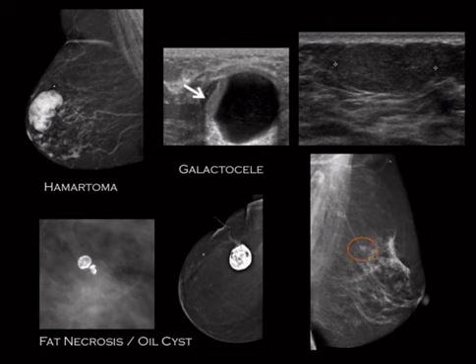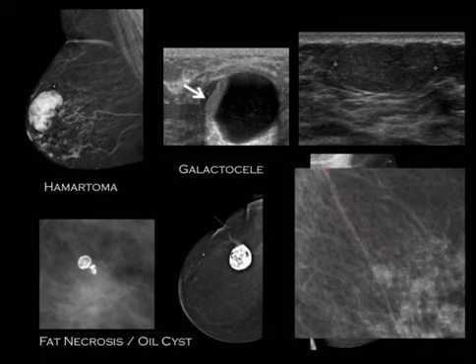And then the last one is this, which notice that is in the posterior third of the breast. Sort of the same as this guy, same as that guy. Sometimes these intramammary lymph nodes will show up in that posterior third, and they are fat containing and they are benign, and you have to sort of know what they look like. You see them all the time. So these are your fat containing lesions. Those are 5 of them. 6 names, 5 entities. All of them are benign. All of them can be BI-RADS 2'd.